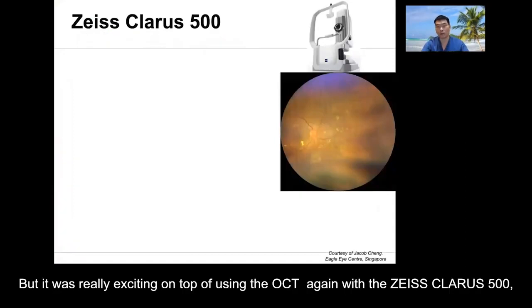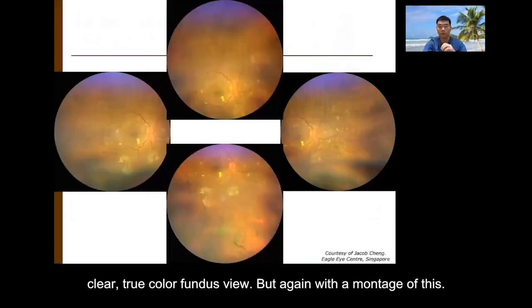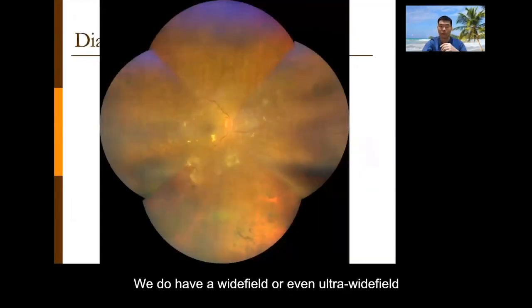But it's really exciting that on top of using the OCT, again with the ZEISS CLARUS 500, not only can I see a posterior fundus view, a nice clear true color posterior fundus view, but again with a montage of this, I do have a wide field or even an ultra wide field.